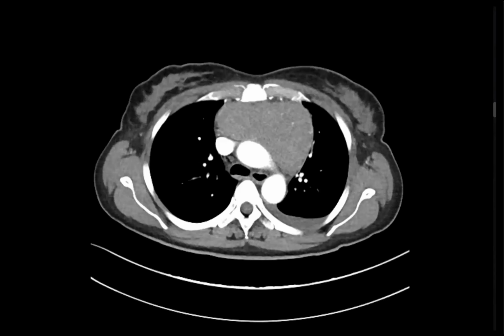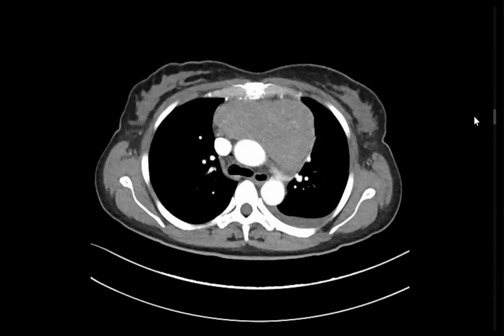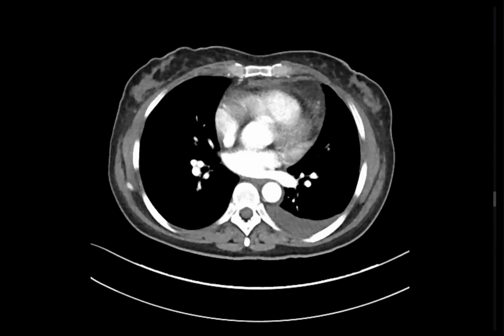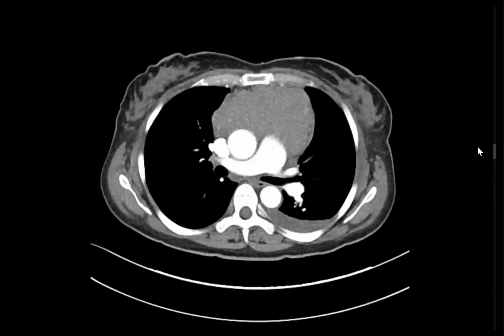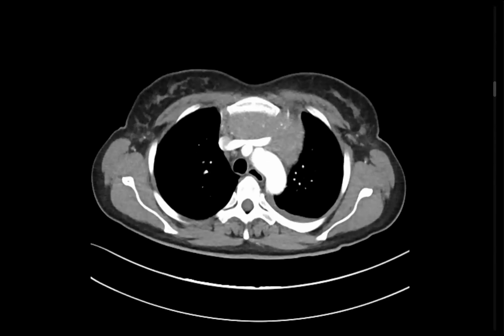There are no calcifications and no fat density in the mass. So this keeps the top differential as lymphoma. I will convey my findings to the referring physician and recommend histopathological correlation and biopsy, and a staging CT of the abdomen and pelvis. Good.